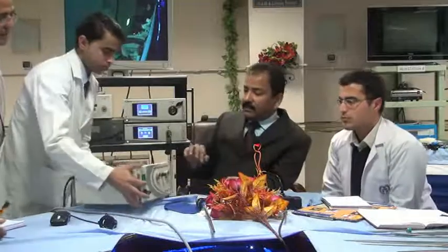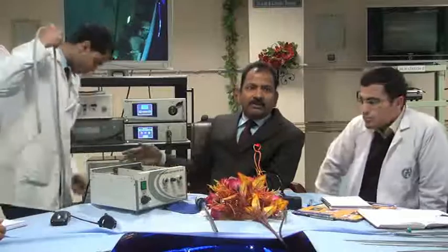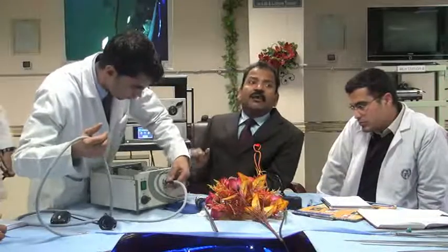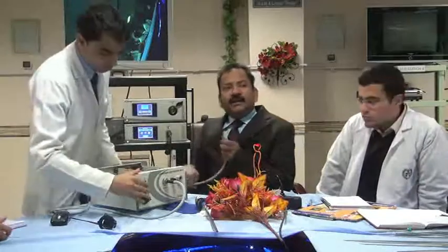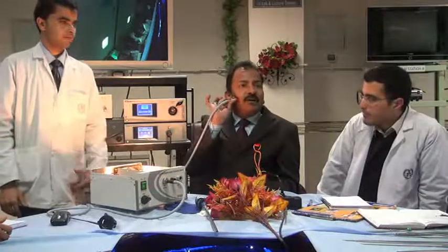Even halogen. I will show you. Let me show you. I am putting it here and attaching. It should be good quality. The company should be good. Any good quality light source, they have this. See, I will keep it for 2 hours. No burn. There is no burn.